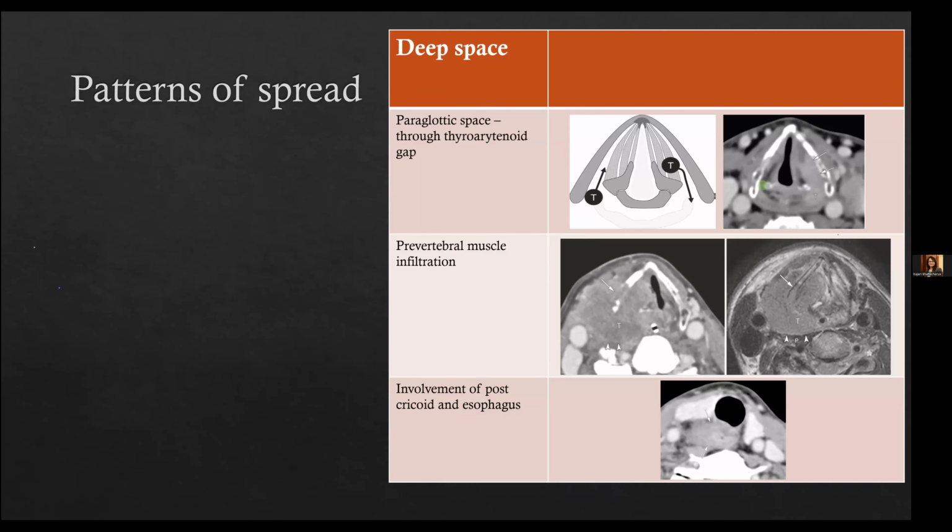So we can identify mostly by that, but sometimes this is still not a foolproof thing, and we cannot delineate it. Such large lesions, which involve one compartment to another, generally have extralaryngeal spread, and we generally place them in T4B or T4A disease. Sometimes just looking at the disease, we can stage it just like that. For smaller lesions, sometimes it may be difficult, and in those cases we have to see where the bulk and most necrotic part of the disease is, which can give us the idea about the epicenter of the disease.